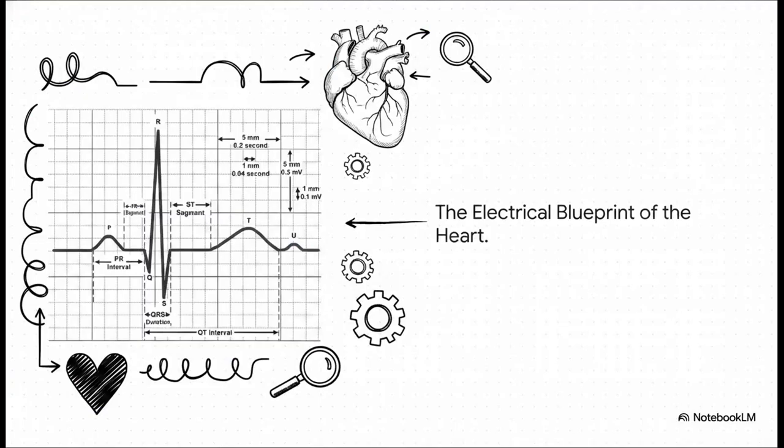Before we get into the nitty-gritty of the system, let's just take a moment to look at what we're actually analyzing. This is the standard ECG waveform. It's essentially the language of the heart's electrical system. And it's this rich tapestry of deflections, intervals, and segments that we're going to learn how to read. Each little bump and wave carries profound diagnostic meaning.